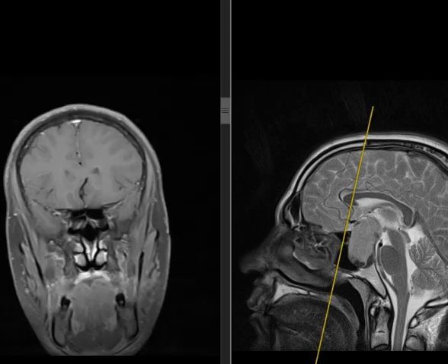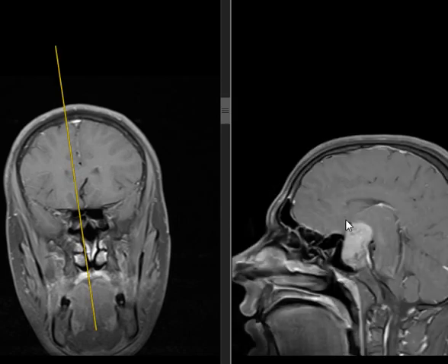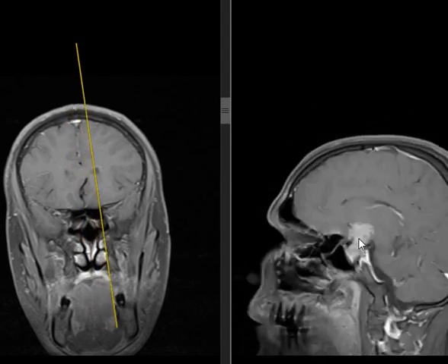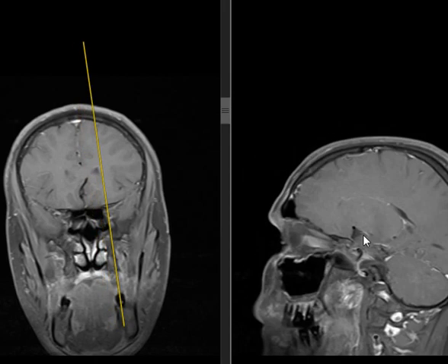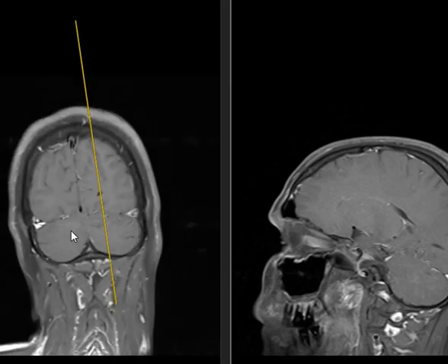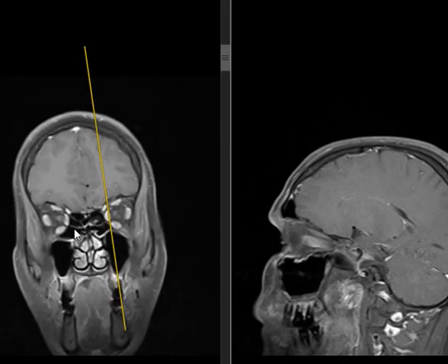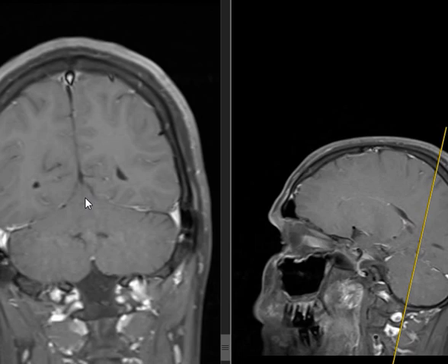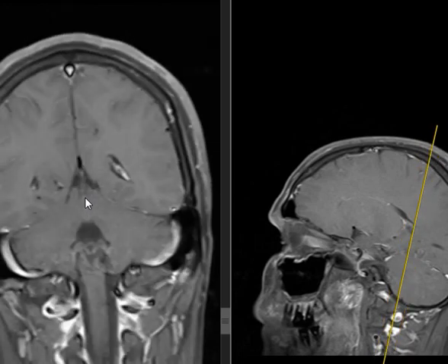Okay? So, we gave contrast, and we have these post-contrast images. Enhanced. Again, whether the lesion enhances or not, it's of no difference to me. I don't care. What I care about is invasion. And where do I see the invasion better? On axial or coronal? Coronal. So let's magnify a little bit. What do we need to see invasion of? Circle of Willis? Or cavernous sinus.